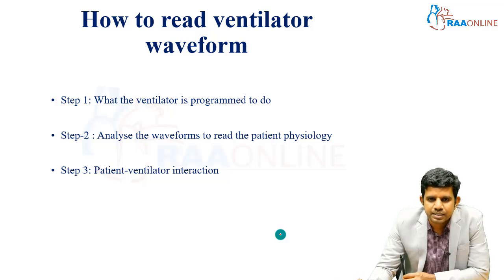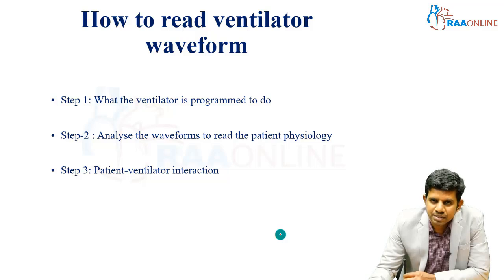The second thing is to analyze the waveform to read the patient's physiology. Once you know the mode, you look at the ventilatory waveform. From these waveforms, we should know what the normal waveform is for this mode of mechanical ventilation, and how any change in resistance and elastance will affect the waveform. So this is step 2: analyze the waveform to read the patient physiology. This is actually called determining the load.